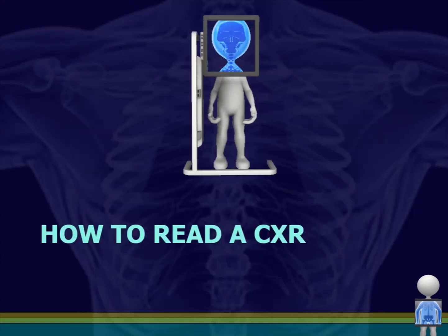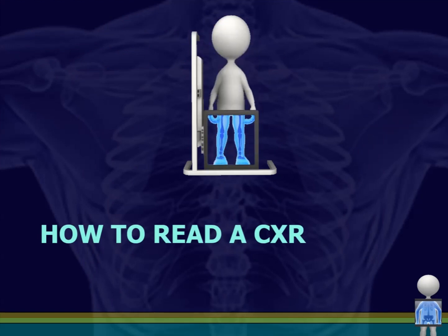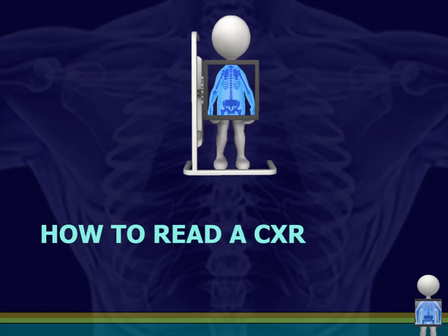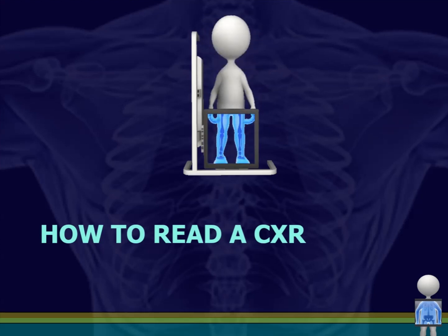So let's talk about how to read a chest x-ray now. There's a very stepwise approach you can take. I'm going to suggest one to you guys today. You don't have to use the stepwise approach, but I think something similar, if not this, is very important to get used to. You need to get used to reading your film the same all the time, and that way it will become commonplace and it'll become second nature, and you won't make a mistake by missing one of the important things that you may have to look at in a chest x-ray.